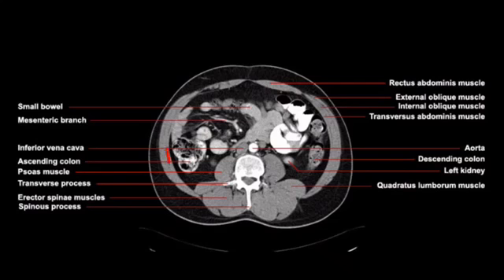At this stage, the ascending colon is very large, and that's because it actually starts at the cecum. The cecum is a very large saccular structure, which is the beginning of the colon, and we're starting to get close to that area. All of these loops of indiscriminate tissues, this is all portions of the small bowel. And you can see that some portions of the small bowel have been filled with contrast, while other portions of the small bowel have not been filled with contrast. We can still see the descending colon here, and again, this is the ascending colon. We can still see those erector spinae muscles.